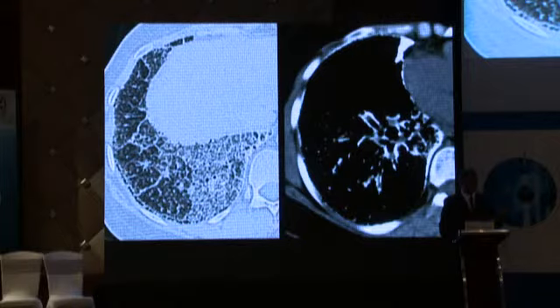It's not real. It's because of the pleural ossification that we get this black line here between the subpleural ossification and the ribs. Very, very interesting condition, quite rare, but seen a lot in Turkey and a little bit in India.